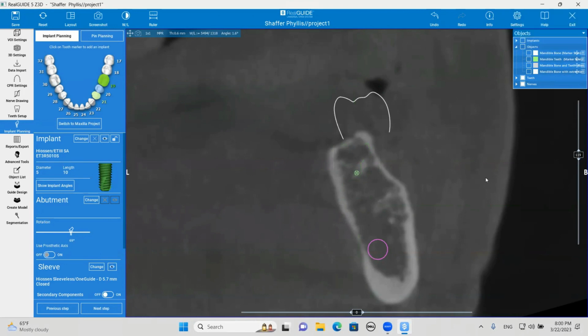Okay. So Nicholas, I know you haven't gone through the first surgical course, but you can read in the surgery textbook, the latest one, the D4 surgical protocol. You're going to under prep this by two drills, and then basically place the implant in an undersized hole. Okay, so you're going to osteodensify it. The reason is the bone density is very, very poor here, rather significantly poor.